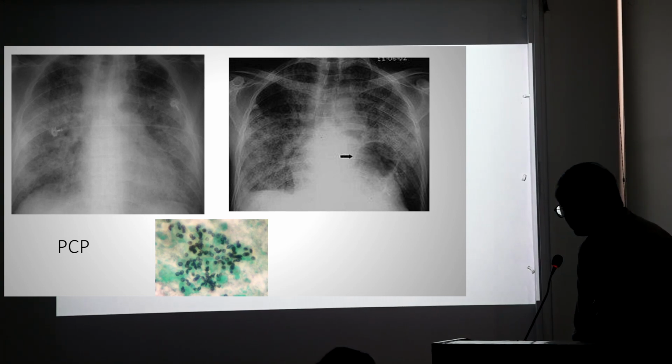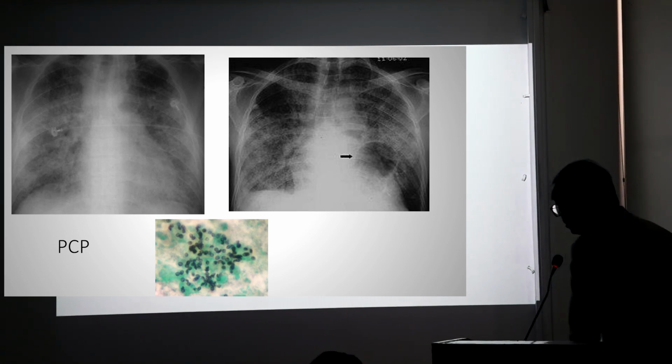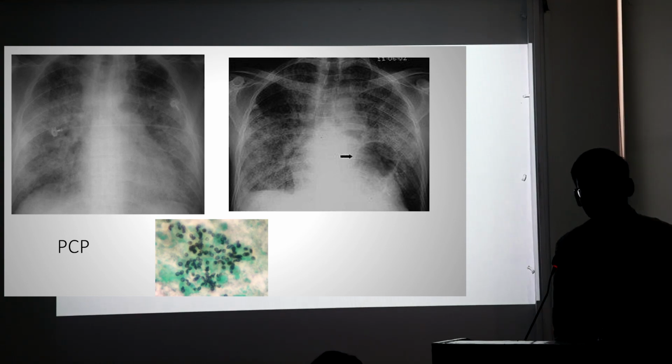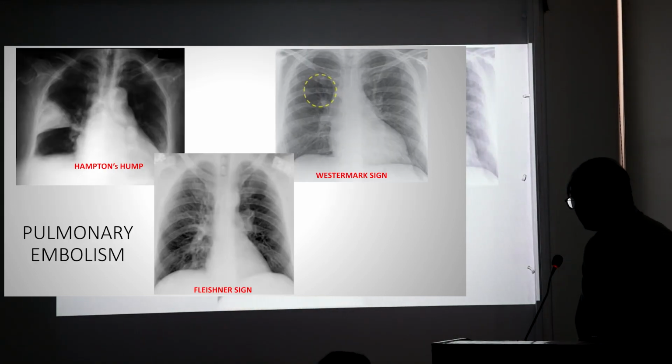What is going on over here? This is an HIV positive patient, 3 months duration of fever, who has now landed up in hospital with breathlessness. It looks more like pulmonary edema. Sometimes we might get cysts, and these cysts can even cause pneumothorax. If we get such a clinical presentation, we always have to think of PCP, or PJP now is the term, pneumocystis jirovecii pneumonia.